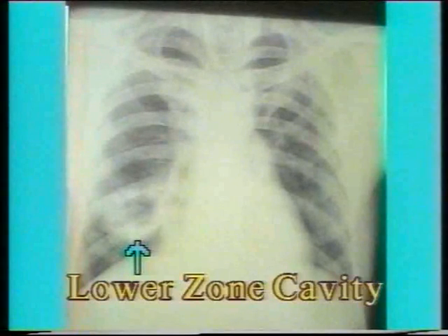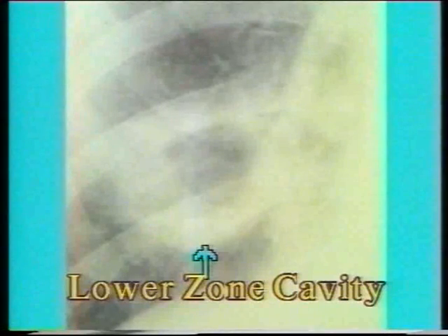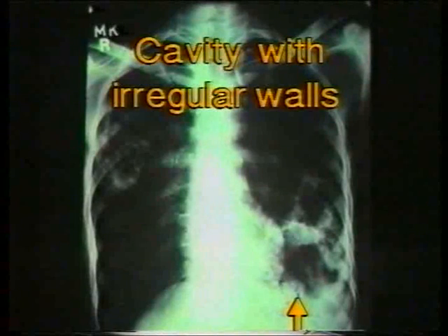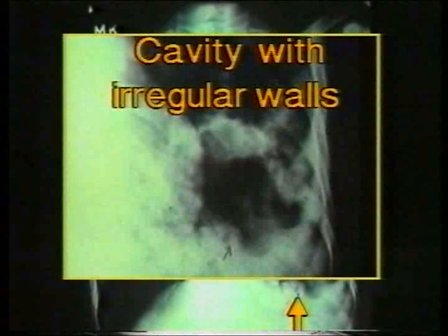Sometimes cavities can occur in atypical locations. This is a cavity in the lower zone. Note the thick but smooth wall, absence of fluid level and surrounding infiltration. This is a large and irregular cavity in the left lower zone. In a close-up view, note the thick and irregular wall. Lower zone cavities and atypical cavities are seen in patients with diabetes and HIV infections.